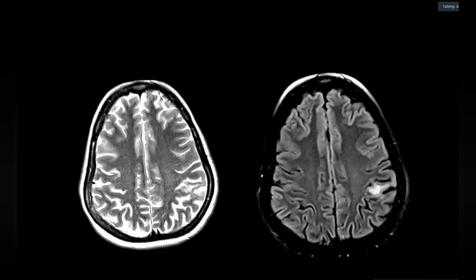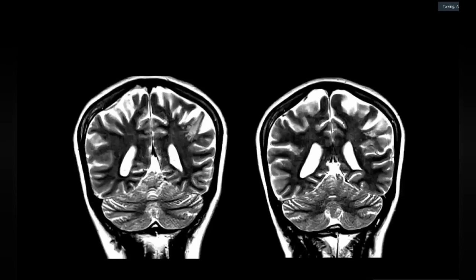This is a very difficult case. It is a very new classification. You already passed, you did with flying colors. I just want to see if you know this one, then you get the distinction. What do you think on this coronal image? This is something, if you have seen it, you know it. If you have not seen it, you will not know it.